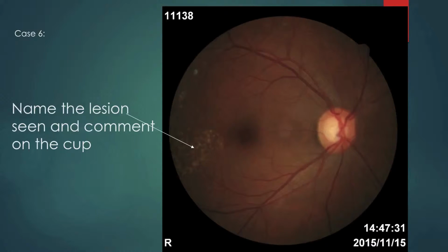This image has a nice quality, and you can see the optic nerve and the macula quite clearly. The nerve has a healthy appearance with a cup to disc of about 0.6. There are drusen outside the central region. These drusen are not indicative of disease, although it would have been okay to refer this patient. We worry more about drusen around the center of vision, around the fovea.